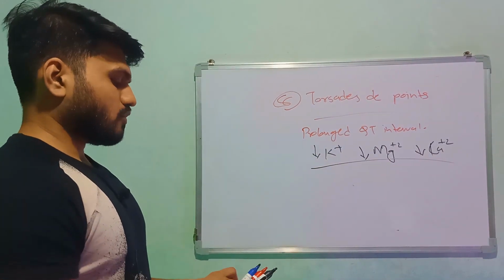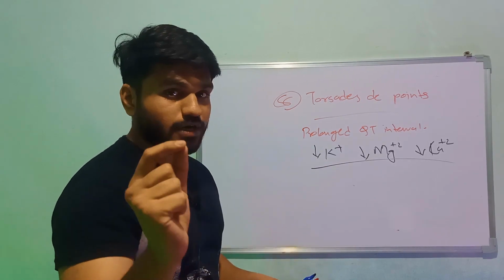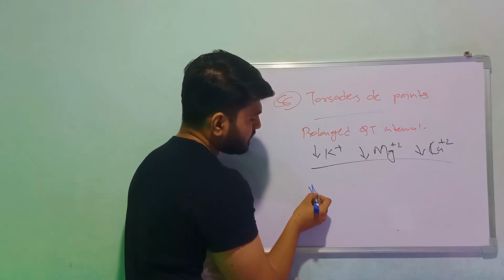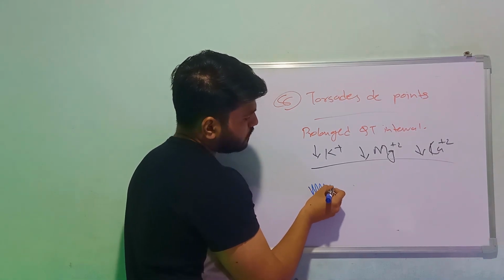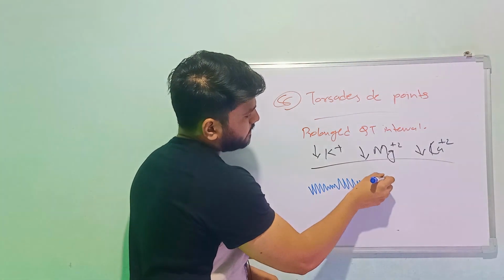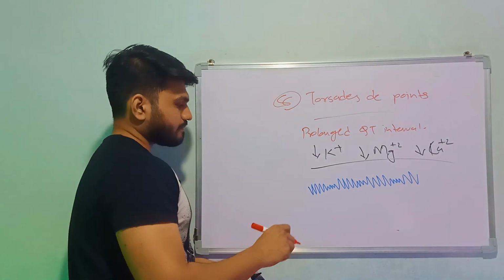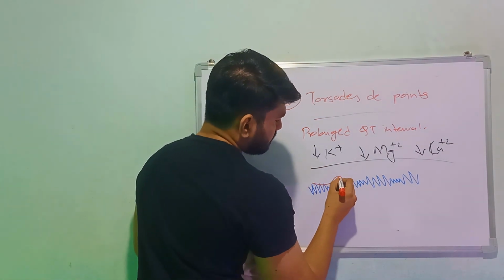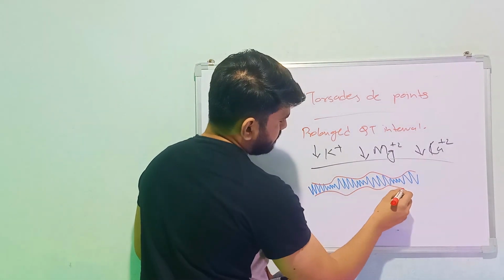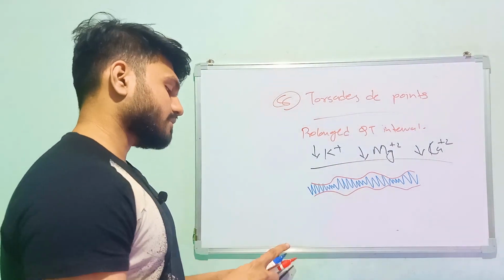And this rhythm looks just like ventricular tachycardia, but there is one difference, which is intensity. So you will see the intensity going down, then again up, and going down, then it is prolonging like this, then going down, prolonging like this. So you will see this pattern. Look here. This is our torsades de pointes. This is a typical example of torsades de pointes.